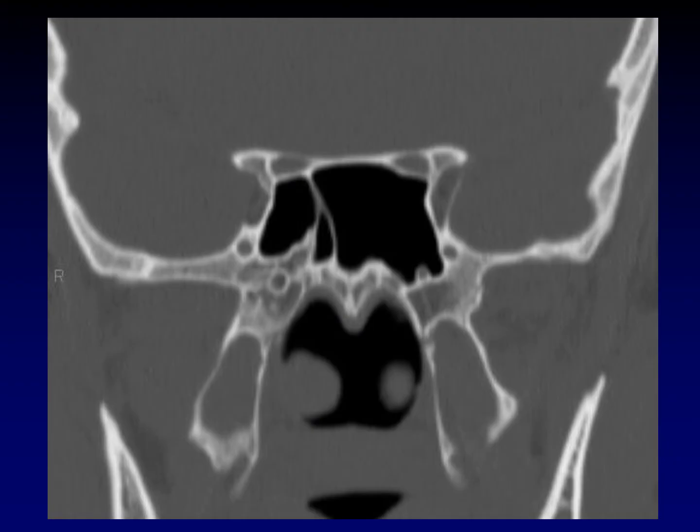That relationship is shown on this classic coronal CT image. The reason that this is a classic is that you're going to be asked to tell which of these two round objects is which. One of them is foramen rotundum. The other is Vidian's canal. So which is which? If you remember that V2 is going over top of the pterygopalatine ganglion, whereas Vidian's nerve is dead ending into the pterygopalatine ganglion, then it becomes a lot easier.